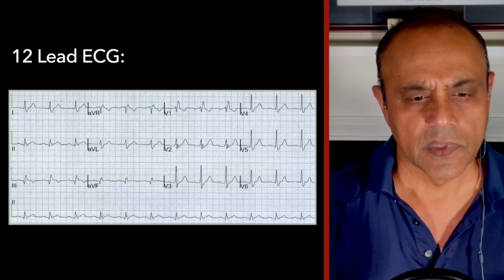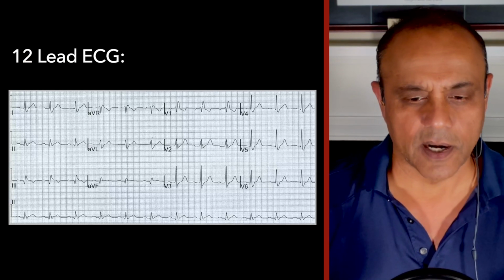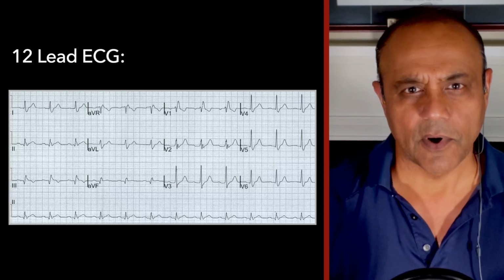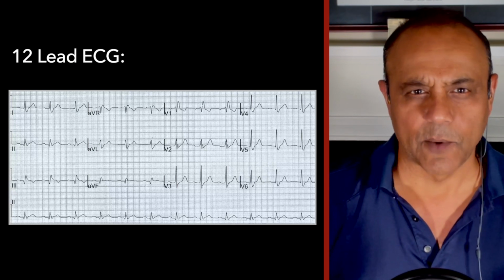All right, so here's the 12-lead ECG. This was done right away. She was put on a monitor and we saw this ECG. Take a look at it, hit the pause button now, as a matter of fact, and see if you can come up with an interpretation, and we'll continue.